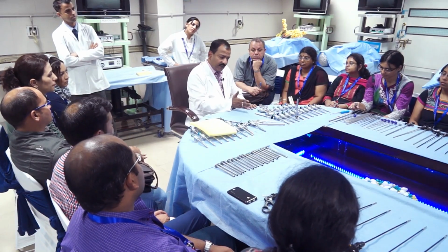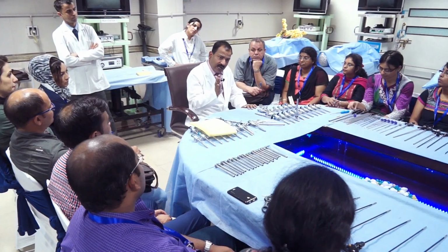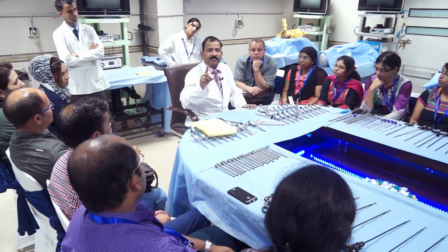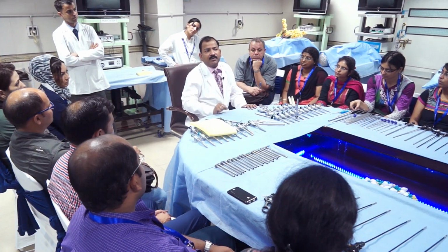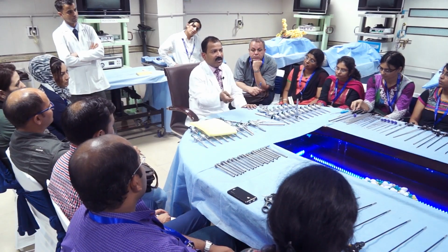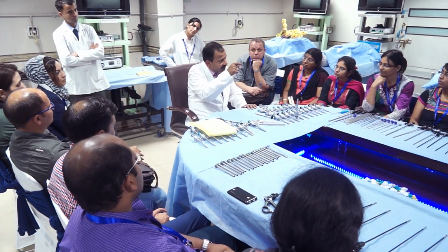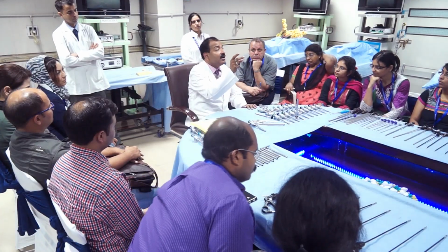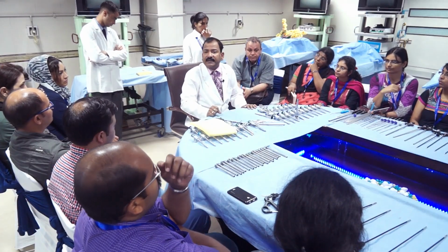You have to learn the complete sequential task analysis, properly programmed 1, 2, 3, 4, 5, 6, and each and every step. The surgeons who do the exact task analysis never have the problem, and the people who are jumping from one step to another without the gap in between have a lot of blanks to fill up, and those are the blanks where there is a possibility of complication. This is the meaning of task analysis.